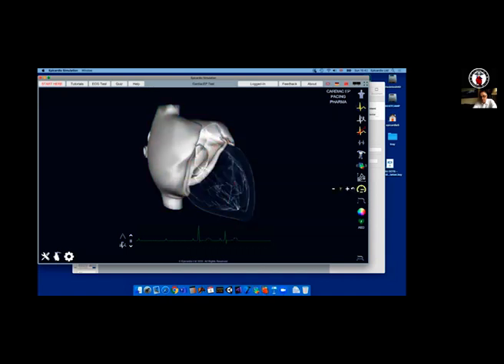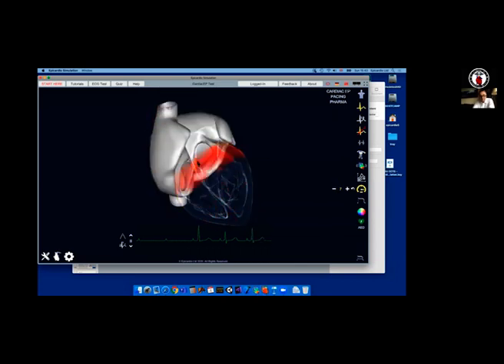And we see all the action potential wavefront propagation going through the heart. And the ECG is recorded as we speak. So it is a live simulated ECG. This is not a playback. This is not a movie, so to speak.